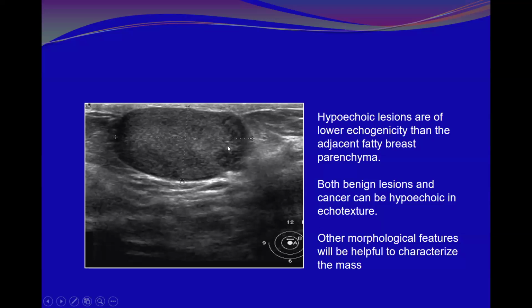Near the nipple, this is my patient's. And can you see, although it is benign, circumscribed and everything, it is giving some effect on the adjacent skin, like pressure erosions. You see this case, a chronic ductectasia with inspissated secretion.